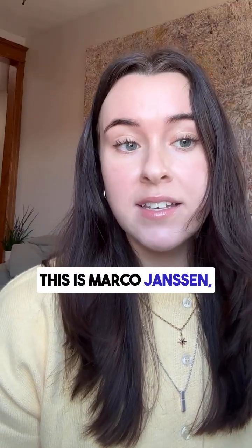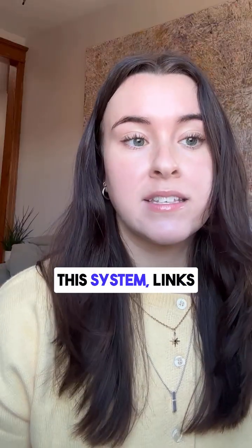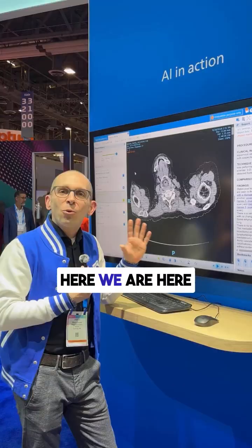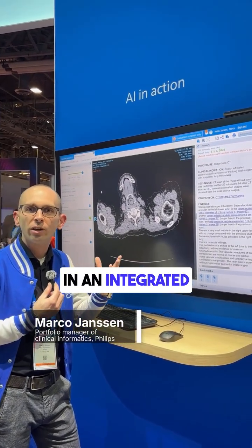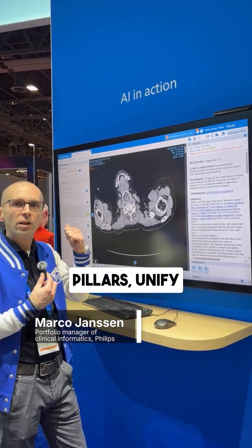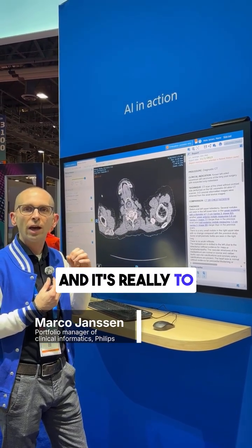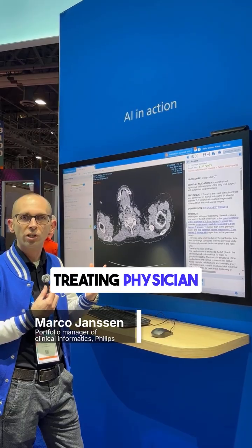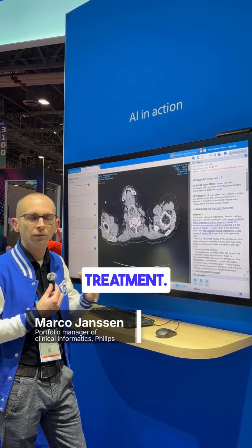This is Marco Janssen. He's a portfolio manager of clinical informatics at Philips, and he is showing us how their integrated diagnostic system works. This system links the images to the report, and you'll get a little bit better idea of that here. We are here at Philips Integrated Diagnostics. Philips approaches diagnostics in an integrated way with three pillars: unify the data, streamline the workflows, and scale with AI. It's really to help the medical professionals, radiology, pathology, but also the diagnostic and treating physician, to come to a diagnosis as soon as possible and to select the optimal treatment.